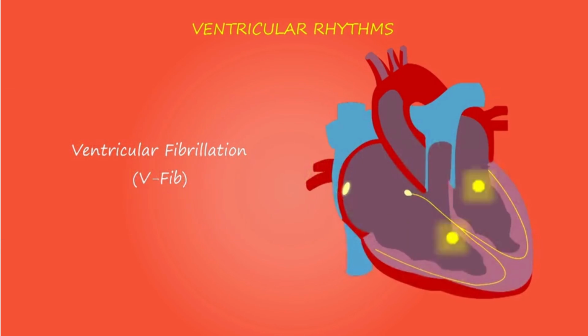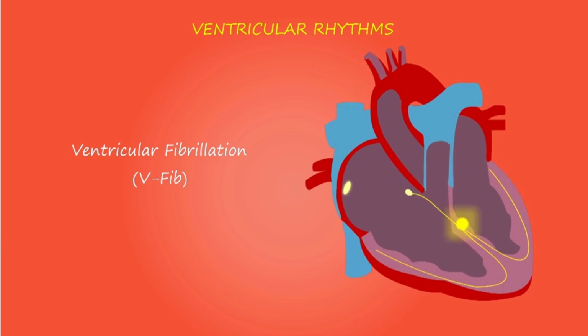Now it is ventricular fibrillation. The rate is changing, irregular, and you might wonder why there are signals in the atria also. Hold on, I'll tell that with experimental evidence later on.